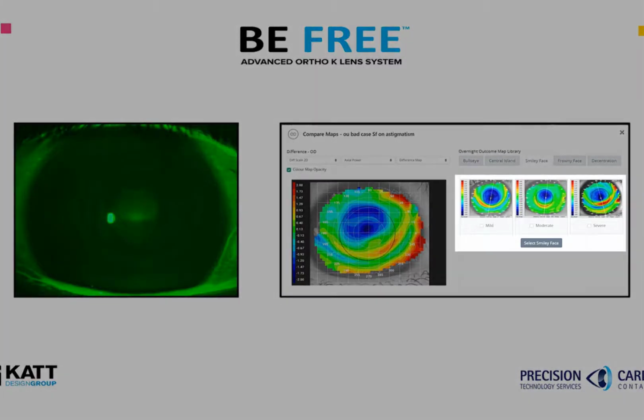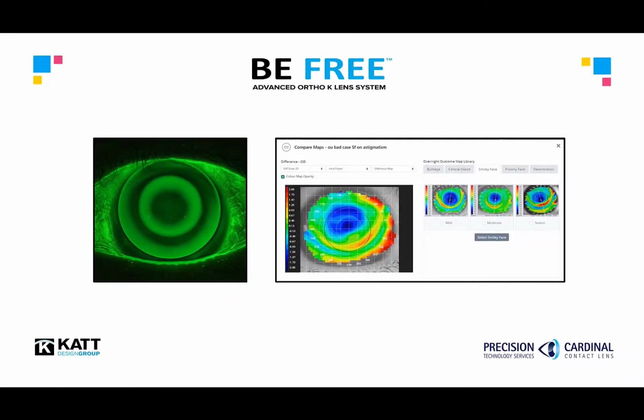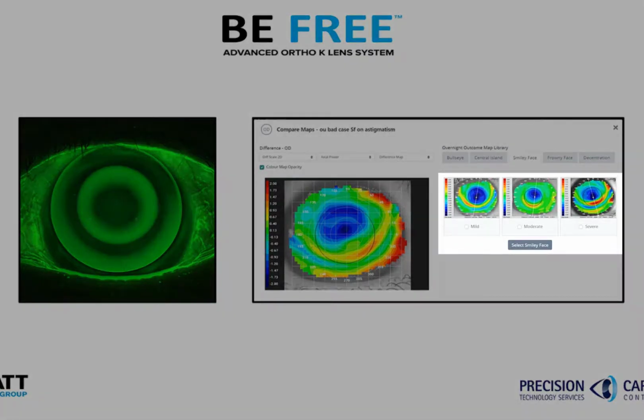Select mild for light touch, moderate for significant staining, or severe when the lens is heavily bearing. A patient that's uncomfortable due to excessive edge lift or a very loose, sloppy fit can also be resolved with the smiley face response. Again, choose mild, moderate, or severe based on the apparent magnitude of change required.